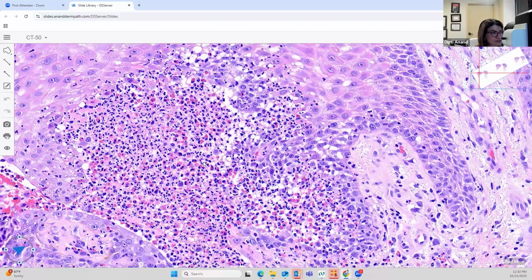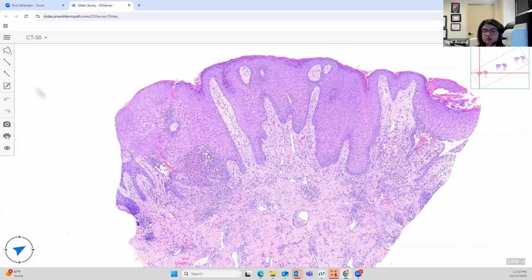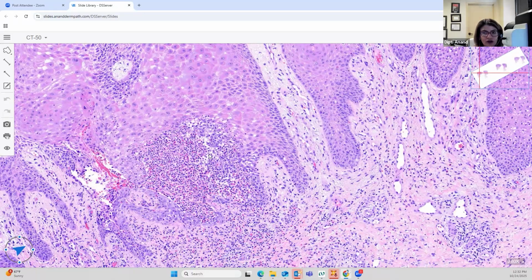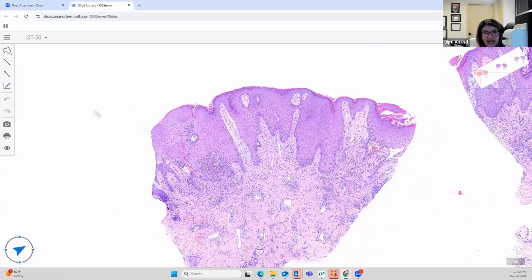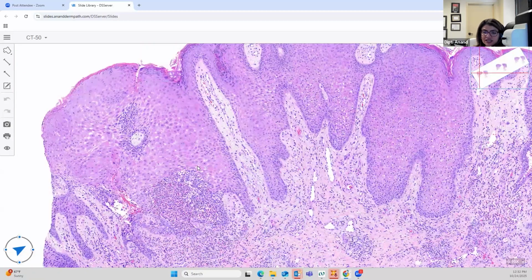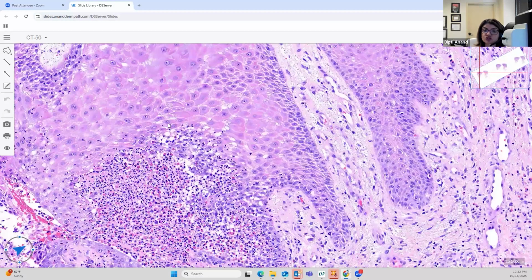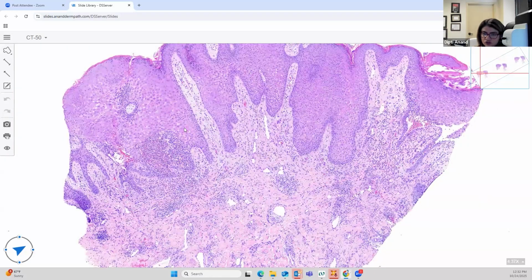This eosinophilic microabscess in the epidermis, accompanying the hyperplastic epidermis, you know, another thing that you think... Yes, exactly. This is pemphigus vegetans. With eosinophilic microabscesses and epidermal acanthosis, you can think about incontinentia pigmenti. That can do that, okay? But typically with incontinentia pigmenti, the epidermis is not that thick, though it can be thick, and you do not really get microabscesses, though you can, but you typically don't. You get more of eosinophilic spongiosis, like what we saw in BP, along with the whorls of necrotic cells, right? Which you don't see in here.